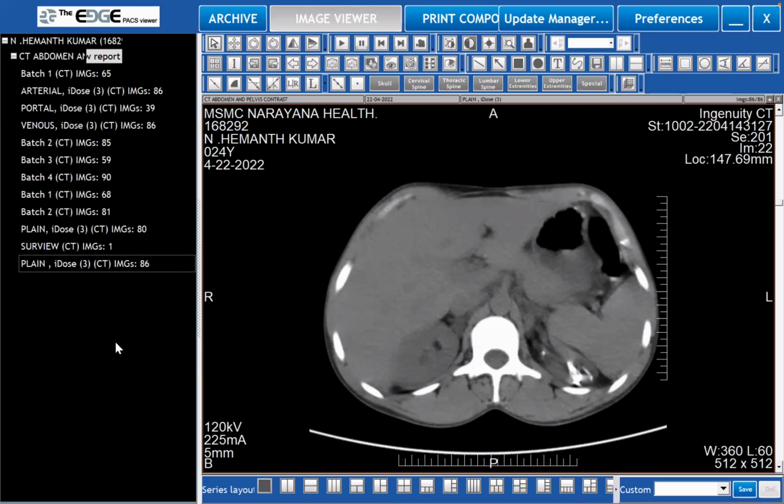Is that an important consideration? Yes. Very important. People don't comment on the sizes these days simply because you get the CT images and you just cursorily go across them. Yes. It would be larger on one side. The right kidney looks larger.